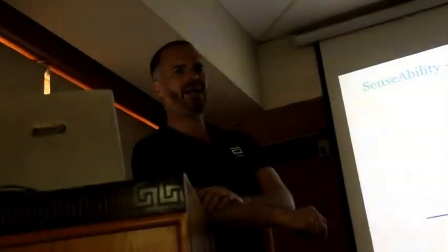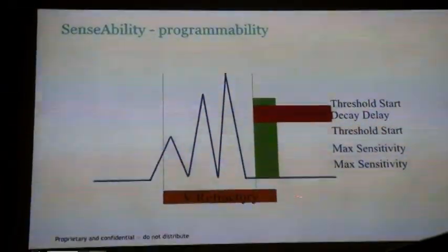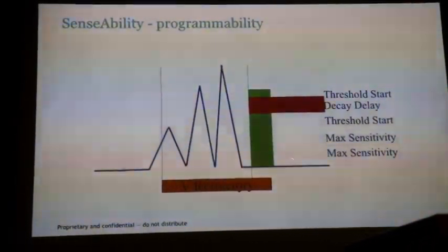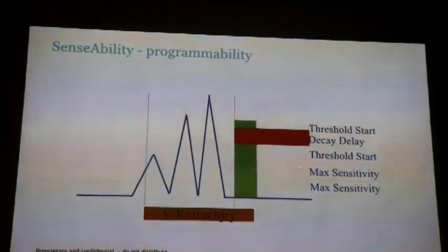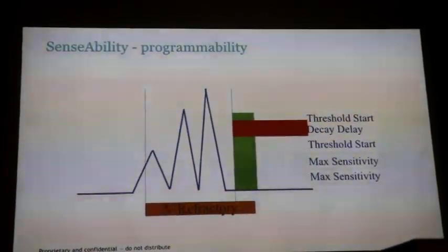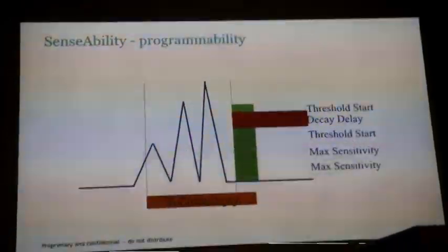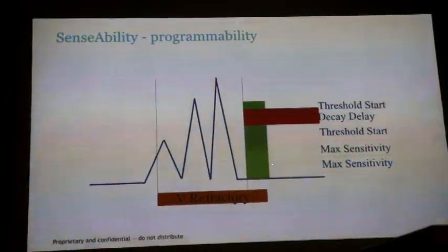Because if it's very wide, it's probably not a great signal. So we want a sharper signal. Max sensitivity, you sometimes might use if you've got T-wave oversensing, but in our device, not normally. This we would normally change if you're sensing the diaphragm. You can sense diaphragmatic signals with ICDs. Anyone seen it? No. Okay, I'll show you. You've seen it. I'll show you it later as well. We've got a couple of nice cases.